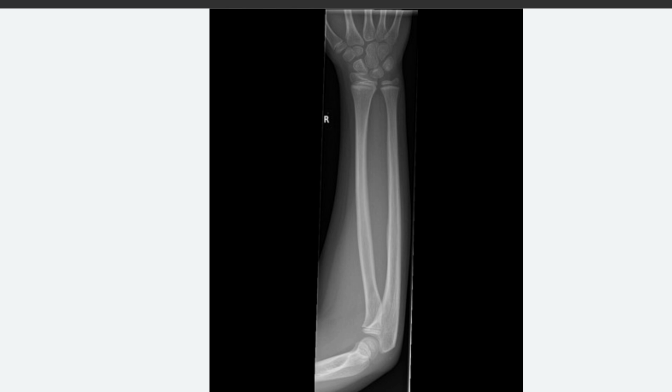Then endosteum, note as for periosteum, loss of it is seen in lytic neoplasm, haziness in osteomyelitis, disappearance due to bone forming neoplasm like osteoid osteoma. Medullary cavity, note the clear outline and differentiation from cortex. Corticomedullary differentiation is lost in osteoporosis, Paget's, and metabolic disease. Identify the pathological structure like lytic, sclerotic lesion, cyst, presence of sequestrum in osteomyelitis. Finally, make a note of intramedullary implant if present and reason for it.